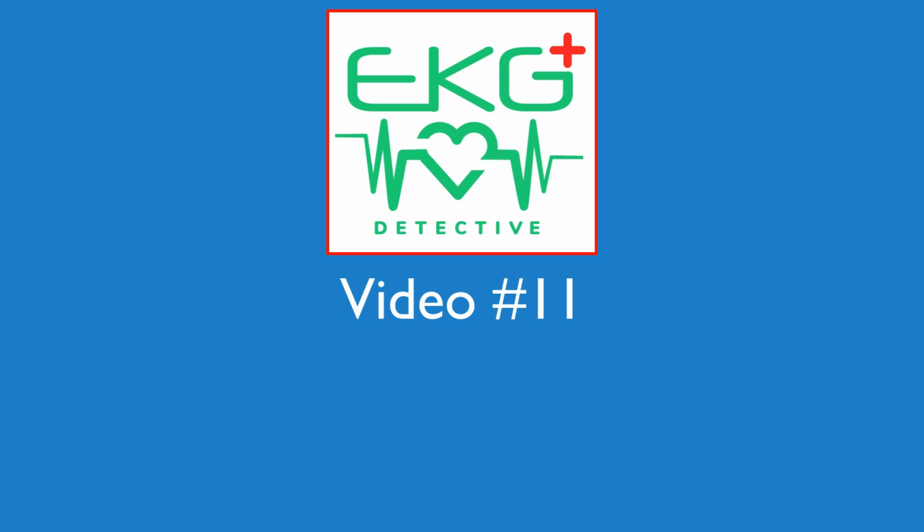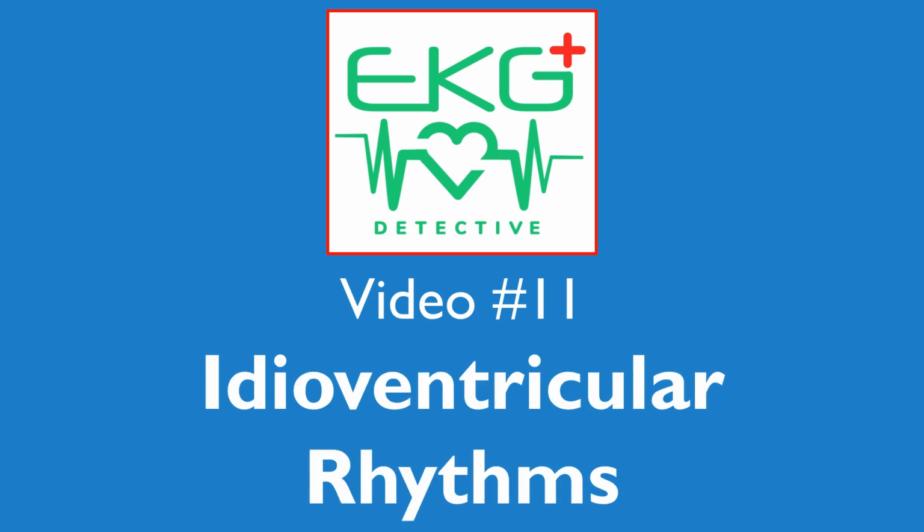Welcome back to video 11 of the EKG Detective. For this episode, we will be looking at idioventricular rhythms.